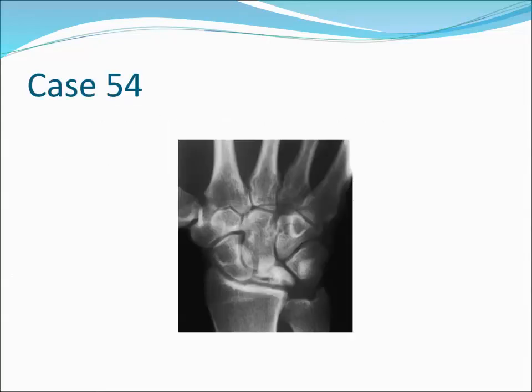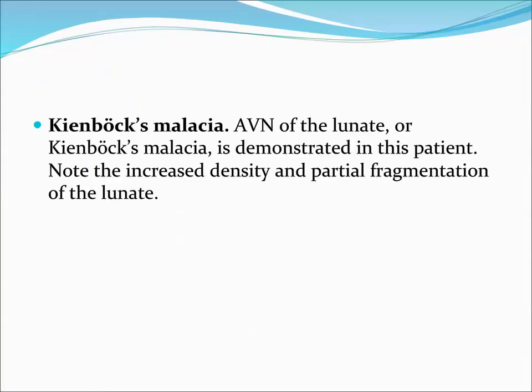Kienbock's malacia. AVN of the lunate, or Kienbock's malacia, is demonstrated in this patient. Note the increased density and partial fragmentation of the lunate.